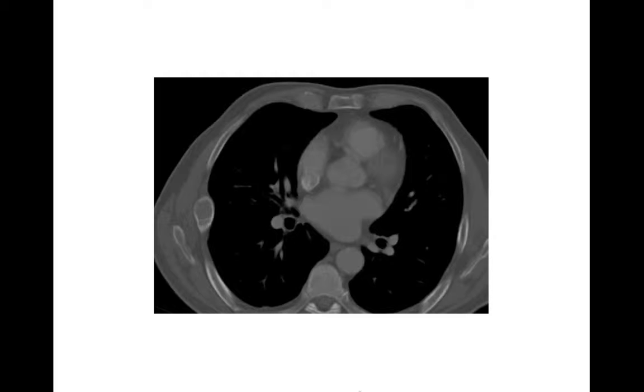Fibrous dysplasia likes to occur in the ribs. It could be fibrous dysplasia. That's a good thought for this. This certainly could be a brown tumor. Brown tumors, you can have multiple brown tumors, and brown tumors can occur just about anywhere. Could this be metastasis? Sure, it could be a metastasis if they had a history of malignancy. Could this be a multiple myeloma or plasmacytoma in an elderly patient? Absolutely.